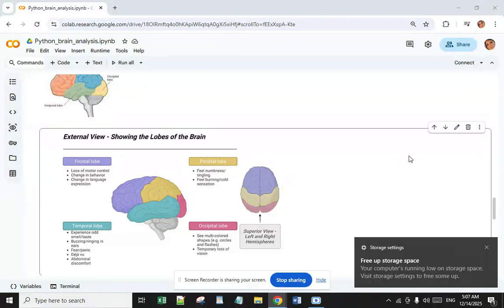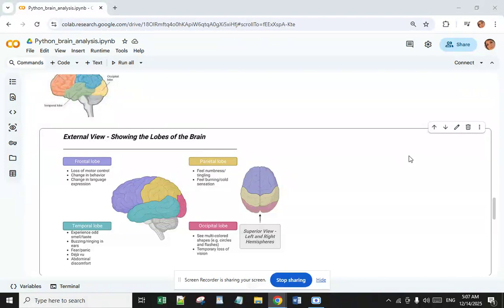The next one is clustering methods to learn a brain parcellation from fMRI. Use spatially constrained Ward clustering, k-means, hierarchical k-means, and recursive neighbor agglomeration to create a set of parcels and display them.